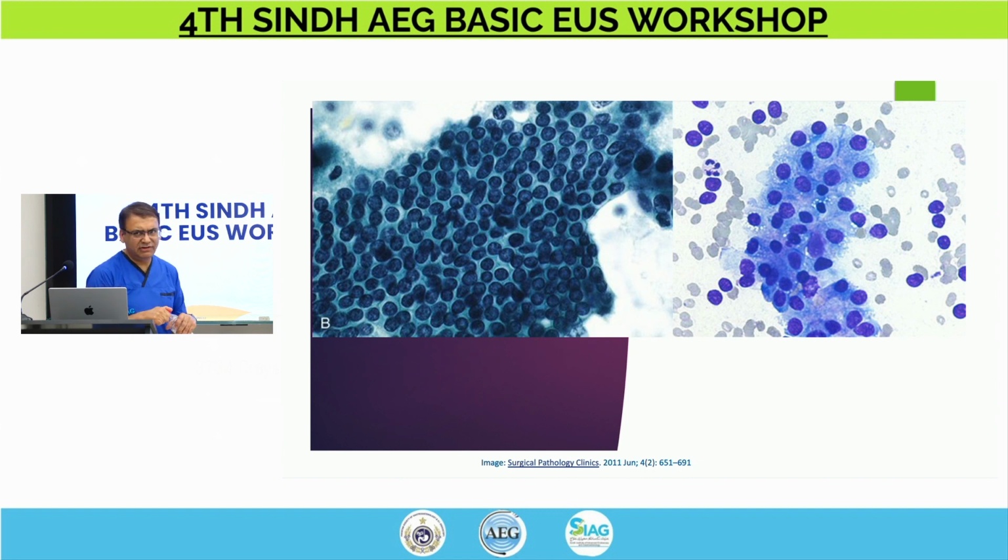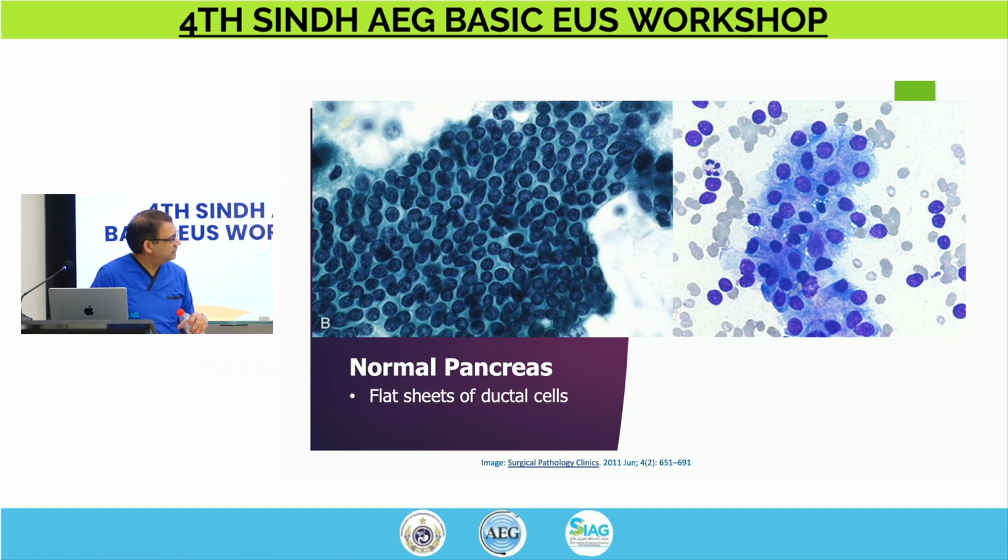And what is that? Why? It is normal, but what normal? Normal pancreas, ductal cells. And what are the other ones? Other slide.